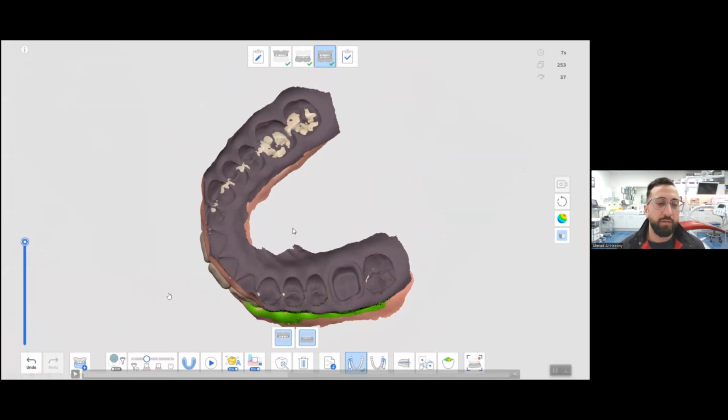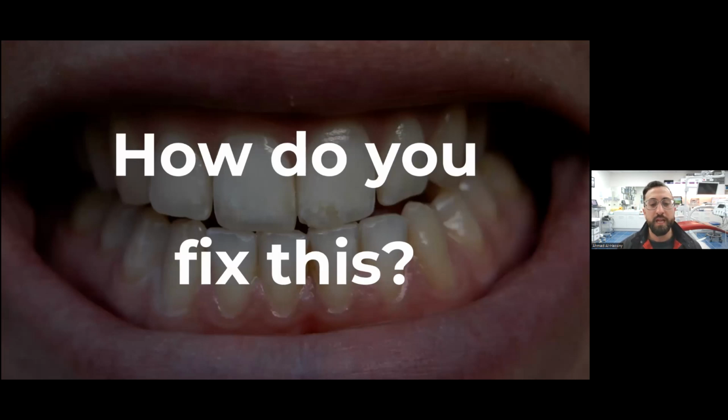And look, the reality is, guys, it's quite an easy fix from my point of view. This has been like this for the past 5 years with intraoral scanners. Again, some scanners are better than others. And a lot of scanners put AI, should I say, in their scanner software to counteract this. So how do you fix this? In my books, the first thing I would do is take bilateral bite scans.